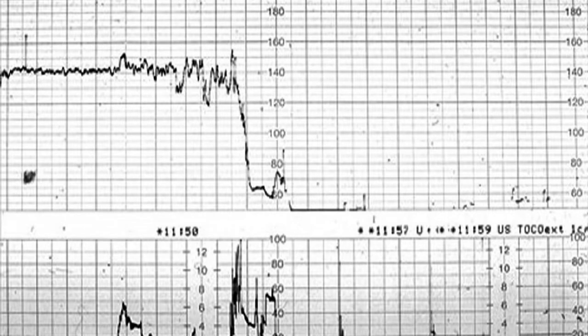In acute bradycardia or prolonged deceleration more than 3 minutes, usually we review the clinical situation to exclude acute events like placental abruption, rupture uterus, or cord prolapse, and start the conservative measures: fluids, stop oxytocin, change the position of the mom, and urgently prepare for expediting the delivery either by instrumental delivery or cesarean section according to cervical dilatation and presentation and situation of the presenting part, and also urgently ask for help from seniors.